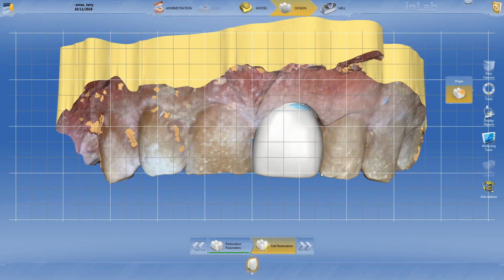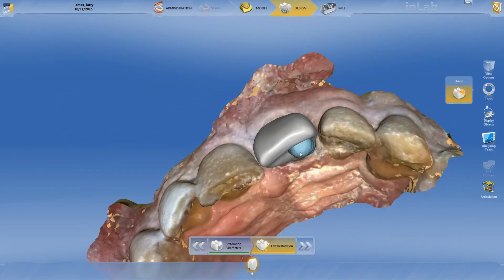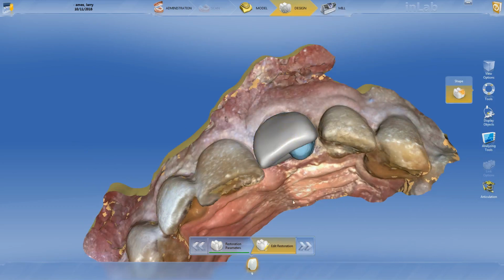So it's around this segment, and we're just about there on this distal incisal edge. Now we'll play with that, but that's where you want the width, or say this is where it's ideal. This is where they're symmetric. You're going to leave it there. You're going to take away this grid, and we're pretending that tooth number 8 is this width.